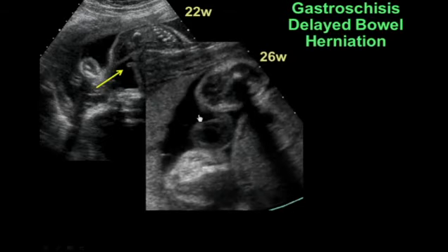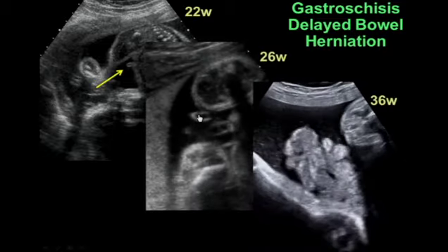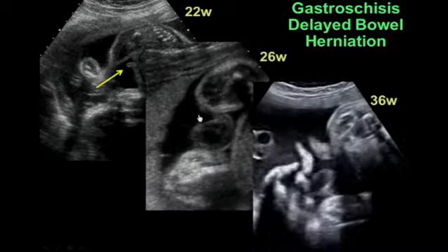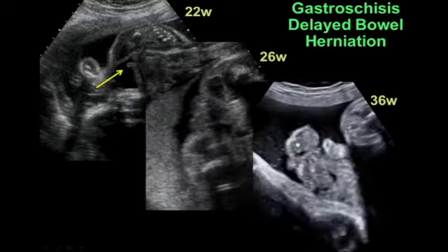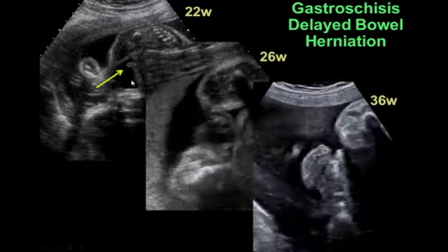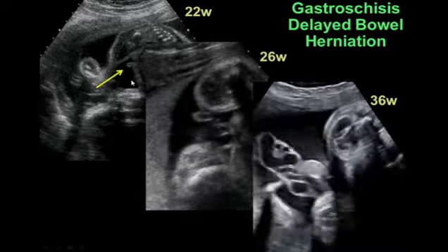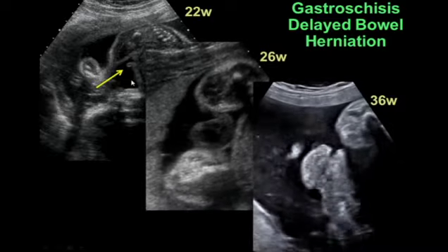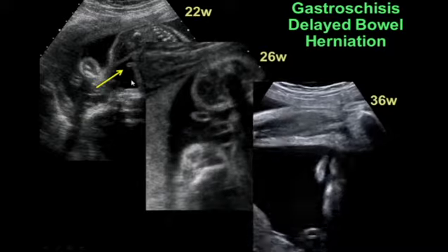We still didn't have any idea that this was a gastroschisis, but when she came back at 36 weeks gestation, now we see many loops of bowel protruding from the anterior abdominal wall into the amniotic cavity. So sometimes these may have a delayed protrusion of the abdominal contents until the fetus grows bigger and the defect gets large enough for the loops of bowel to pass out into the amniotic space.